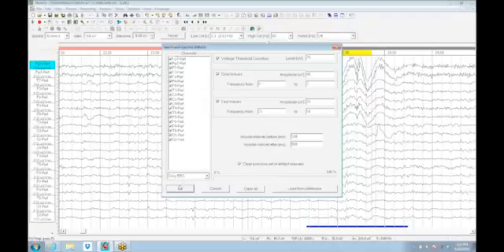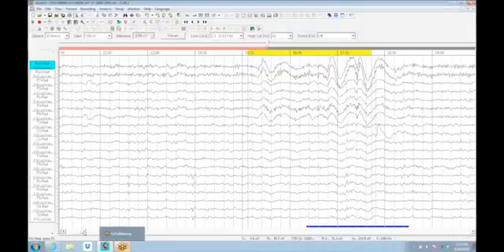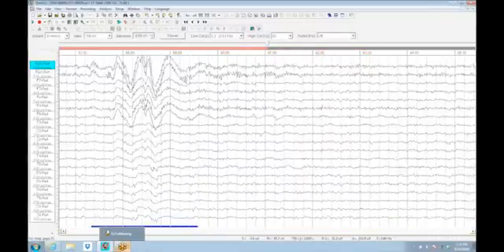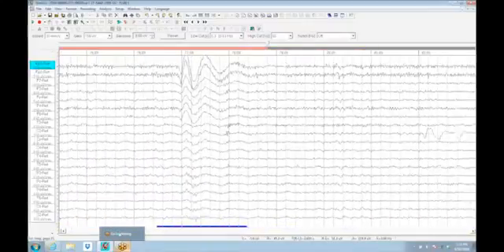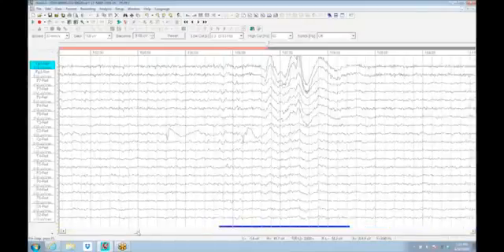And again, adjusting this slowly to catch all those little pieces, you can end up with an automated catch of all of the pieces that meet the definition. And again, there are pieces that are being left in here that you're not going to want to leave in. But this automatically catches the bulk of all of those.